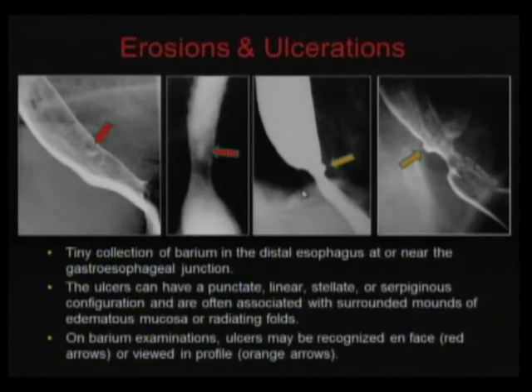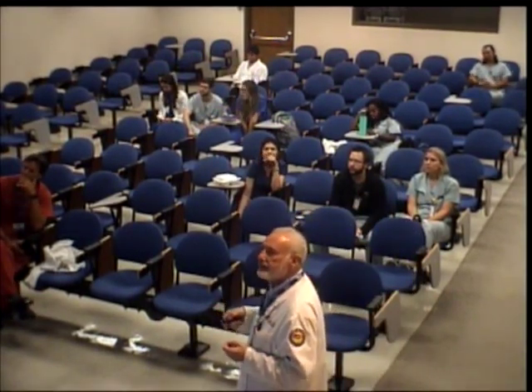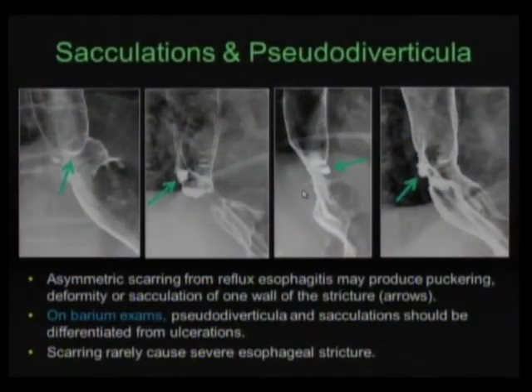It's not an option. Are the convergent folds here? Because I saw the next slide shows the convergent folds. Yes, yes. So, well, in this case, it's different. These are not ulcerations. They are sacculations. So in many cases, you can see the folds, and the folds do not converge to this point. There are no converging folds here. The folds go to other areas, but not to this area. And sorry? No, this is pouching. This is pseudo diverticula.